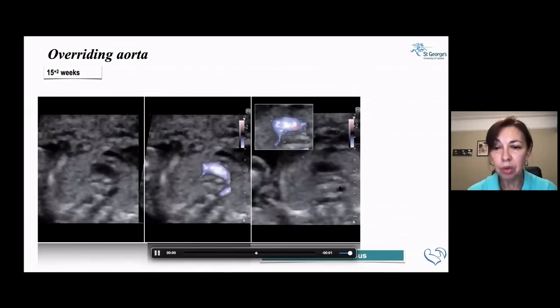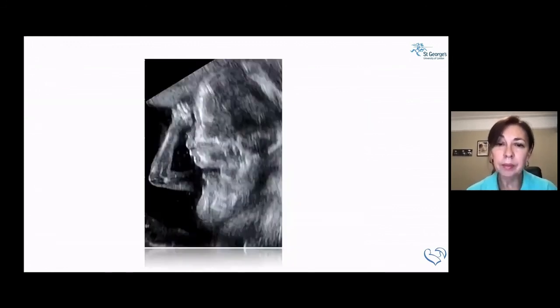So this is the truncus arteriosus, as the image is indicating. I quite like this picture because it's kind of very pensive with the fetus. You know, what else can we do? And I think there will always be something else. One, because we are interested. If you're participating in this webinar, you're interested in the fetal heart, and I'm very glad for that. The companies are having wonderful equipment these days with lots of possibilities, digital imaging. So we do need to make use of everything that's there and make the most of it for completing the sequential segmental analysis of the fetal heart.